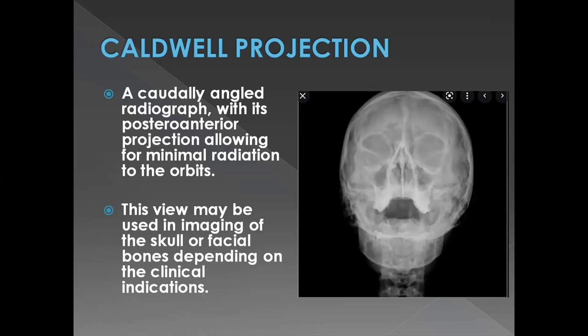All right. Now, this is an X-ray that we commonly used to see in our patients that used to be brought to my center. I work at Khyber College of Dentistry. So most of the patients from the periphery used to bring this X-ray with them. And I used to think this was just a very odd or poorly taken Waters view. But it turns out it was actually a Caldwell projection. And this is a projection which is actually done for the frontal sinuses.